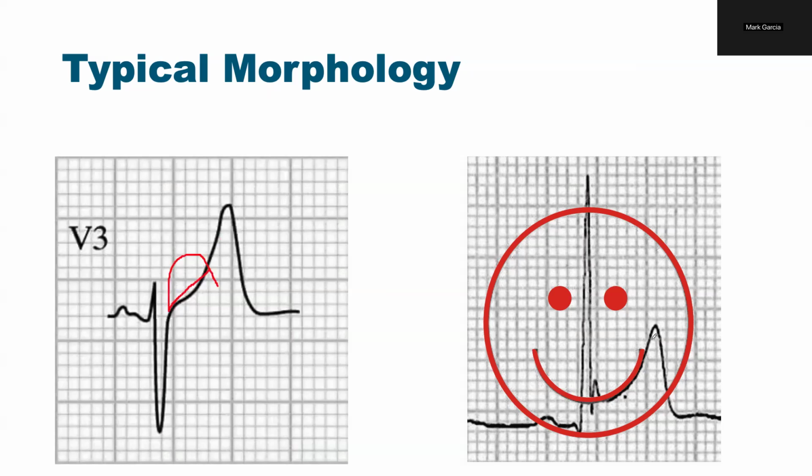The other difference you might see is that you get a T wave that is asymmetrical. So asymmetrical T waves are less concerning. You'll notice that the descending limb of the T waves is a bit straighter and steeper than the ascending limb. So that is less concerning and is more suggestive of BER or benign early repolarization.